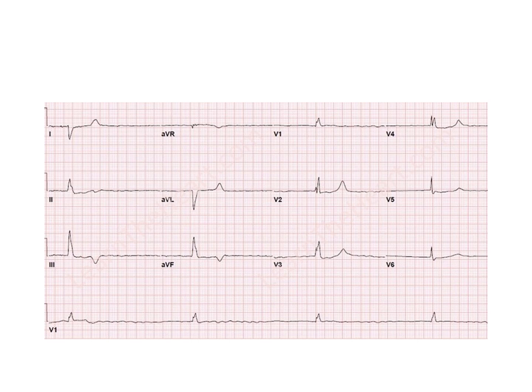Also, going from the top, this is a case of slow atrial fibrillation. We are used to thinking of atrial fibrillation in the fast terms, right? Because most of the atrial fibrillation is fast. However, there are 2 conditions in which atrial fibrillation can be slow. One is simply we have given someone too many heart rate slowing medications like beta blockers or calcium channel blockers. And 2 is somebody who is chronically in atrial fibrillation and now has developed essentially a sick sinus syndrome. So the overall speed of conduction has slowed down.